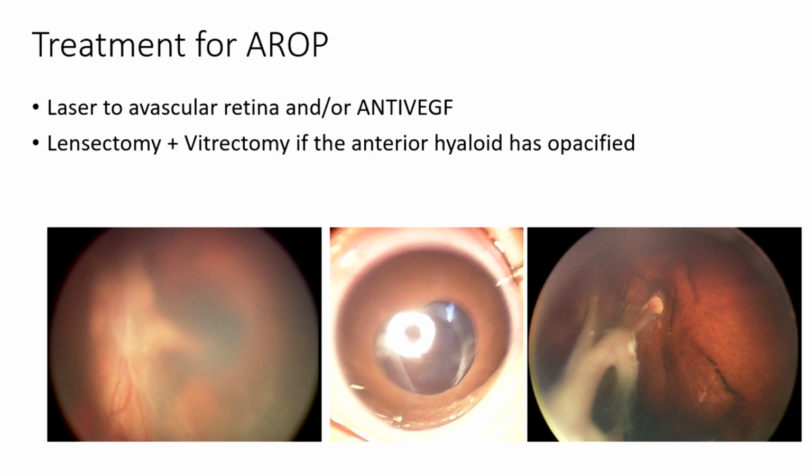So for the laser, to see that the environment is good for laser, what are the things you see in that eye? Traction is the next level. So in 1 week, traction may come or may not. But your decision was like third day, you wanted to treat with a laser. So what environment do you see in the eye when you want to decide the laser? Tortuosity would have come down, pupillary dilatation would have increased. Then vessels, anything you see in the vessels, you're seeing here. Showed the very good photos, no?